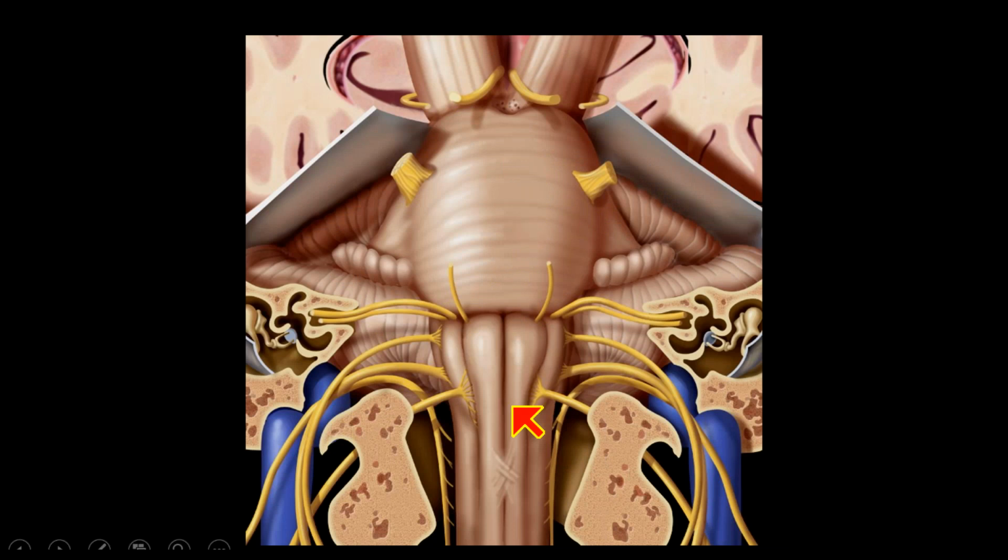So here in this coronal view, where we think about where the pons and the medulla are, we see the 6th nerve coming out here at the pontomedullary junction. 7 and 8 usually actually come out the bottom of the pons, but we think about them going over to the IAC. Here we see 9, 10, and 11 all going over the head of the buzzard, kind of in the sagittal view, and this coronal plane through the occipital condyle. And then we have 12 coming out below it. So this is some important anatomy right here centered around the jugular foramen when we think about the lower cranial nerves. So we'll look in some detail at this on graphics, and then we'll look at it on imaging, and then we'll look at pathology that happens around this area.